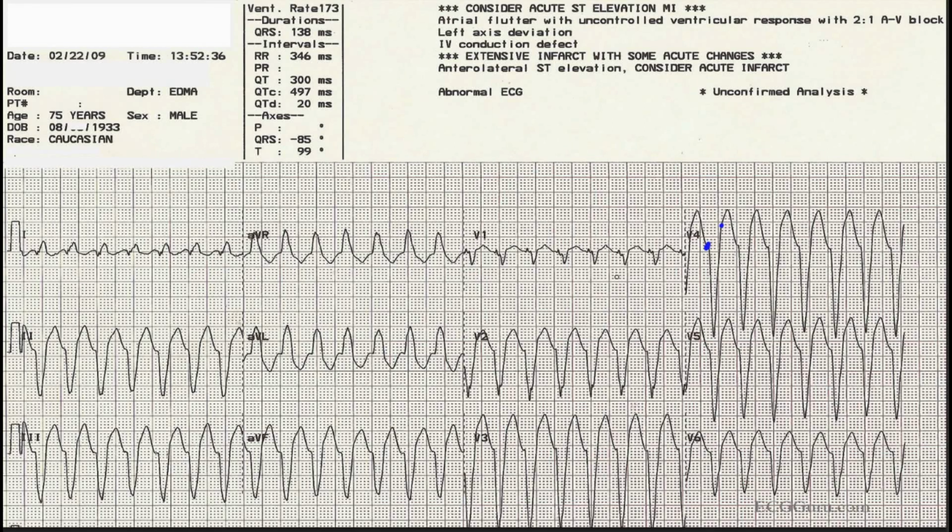The next thing that doesn't always show, but when it does, it's a really good indicator of VTach and can make you very confident, is when you look at the precordial leads, which are the V leads, the chest leads that you put on the patient's anterior chest, V1 through V6. When all of those leads point in the same direction, the words for that are precordial concordance. They might all point upward or they might all point downward, but either way, precordial concordance is a strong indicator of VTach. And in this case, they're all pointing downward.